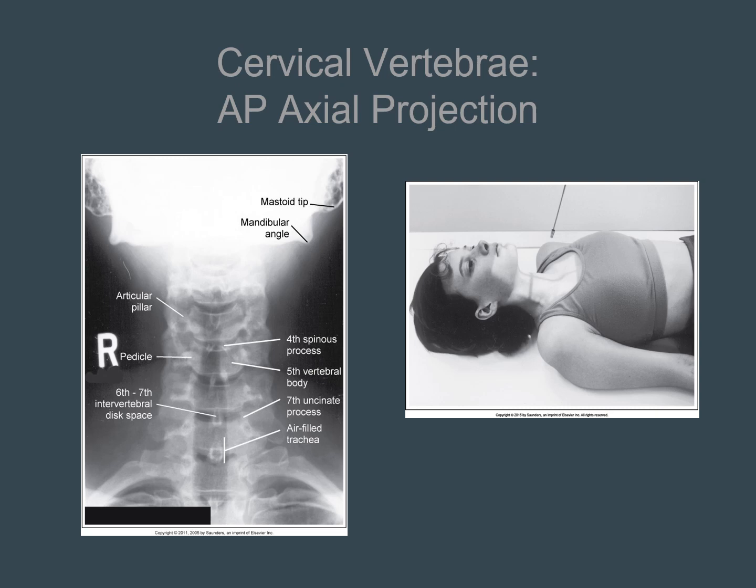The intervertebral disc spaces should be demonstrated as open. Vertebral bodies are demonstrated without distortion. Each vertebra's spinous processes are visualized at the level of its inferior intervertebral disc space. The third cervical vertebra should be demonstrated in its entirety. The occipital base and mandibular mentum are superimposed.